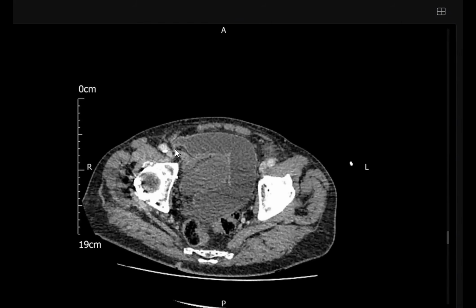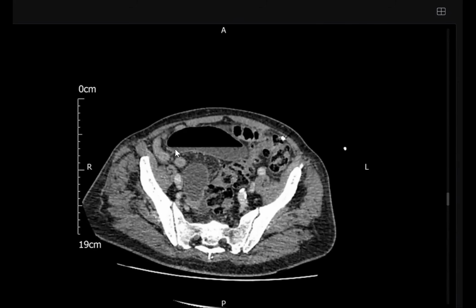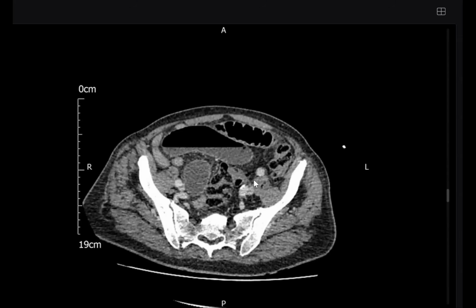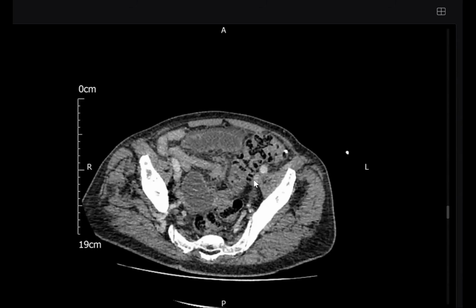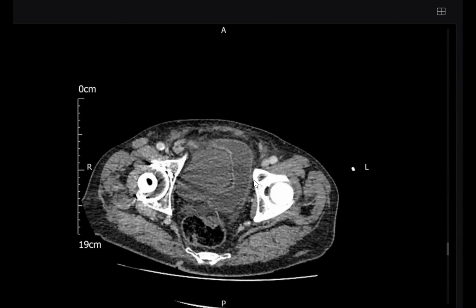It's not related to the obturator. Go down, go down. I'll show you the obturator. Go down, go down, go down. It's not related to it. So what is the type of this herniated bowel loop? Yes, it is related to the lower abdominal wall. A lower abdominal wall hernia. Good. This is a general term.